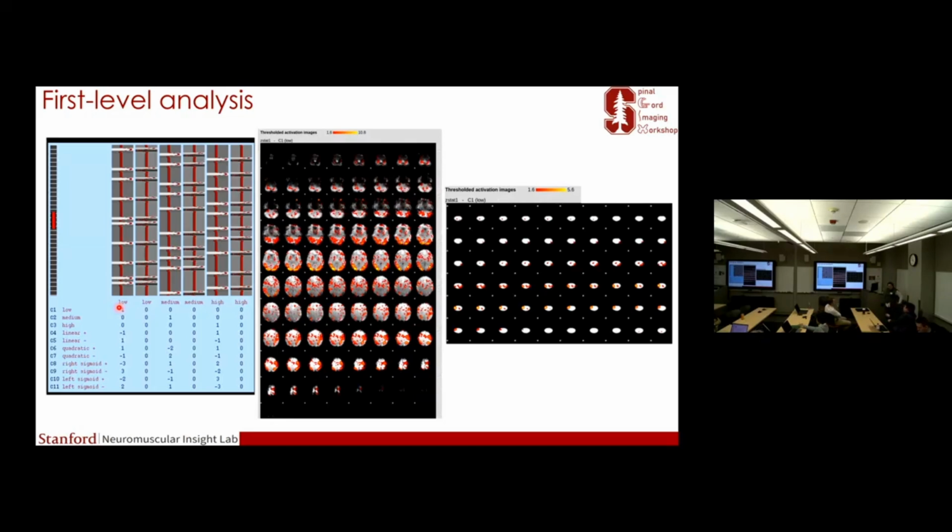I was working with the brain, typically at the very beginning with the EPI acquisition, the signal has a very high value, and then rapidly goes to the average signal. Some people call it steady state, and we usually discard the first eight or so volumes at the very beginning.